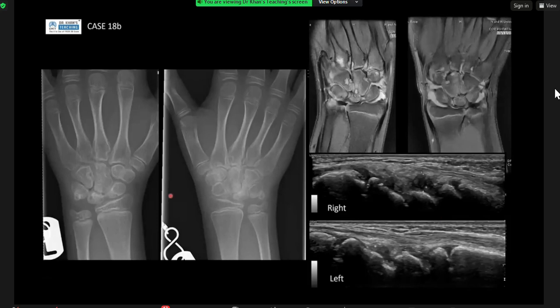On the other X-rays, what you can see here, nicely picked up, is that I guess it takes time to get your eye in, but if you look at quite a few wrist X-rays of the same age, you notice that there will be a bit more joint space between the proximal carpal row. Distal carpal row still looks okay. This, the mid carpal row, the space is quite narrowed. It's called a bit of carpal crowding. There's also sclerosis. It just doesn't look very happy in the proximal carpal row.